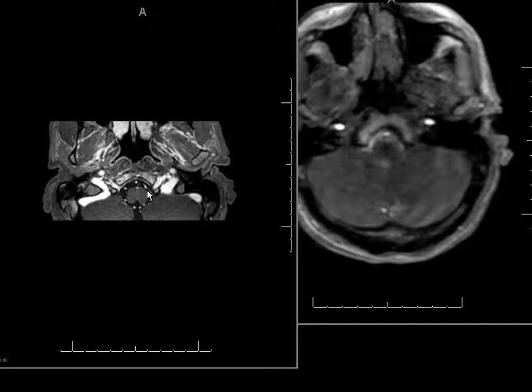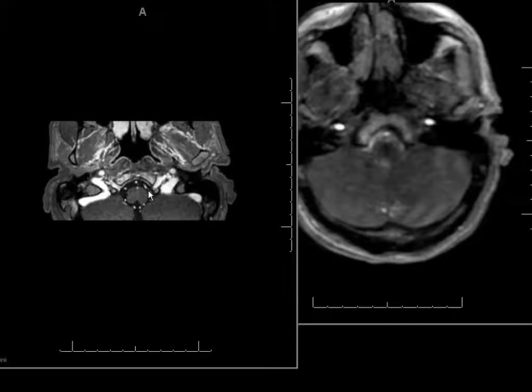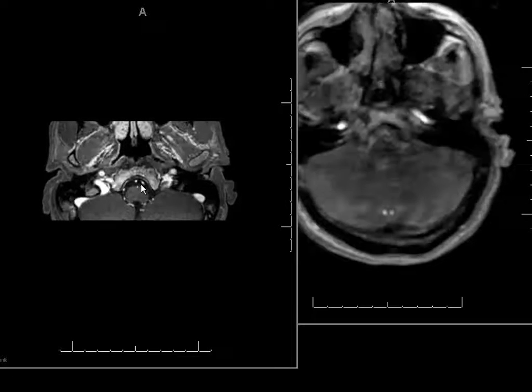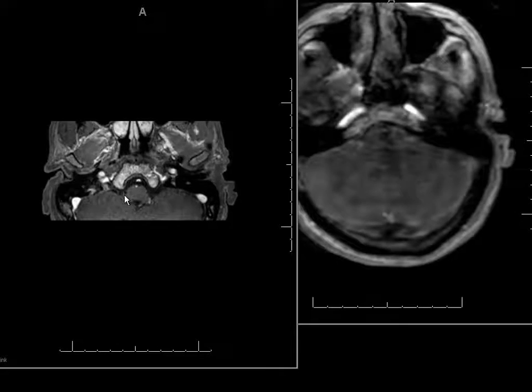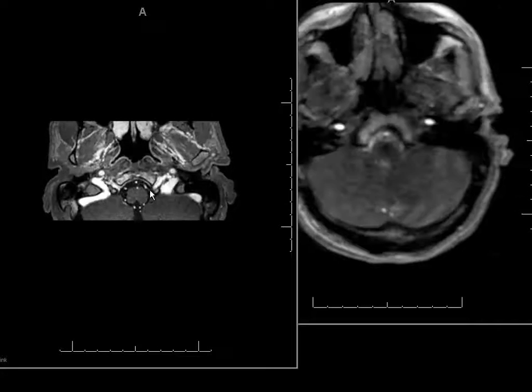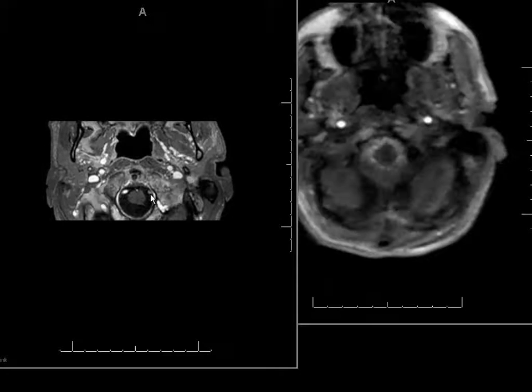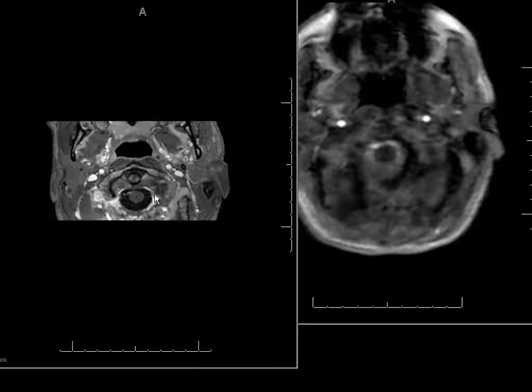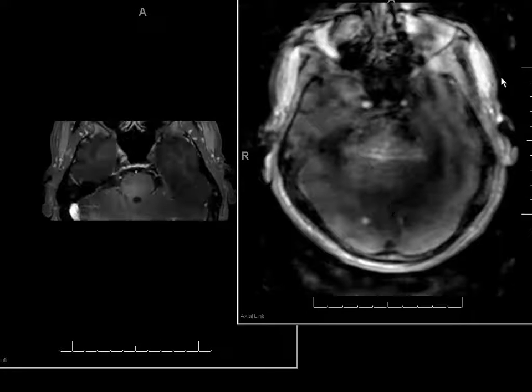And then after the vertebral artery has its junction with the PICA, it's more obvious to see the PICA and distal vertebral artery, probably from the contralateral blood flow. But still, I proved this vessel is not occluded. I still demonstrate contrast within it, versus on this side you just don't know, or you cannot rule out occlusion.